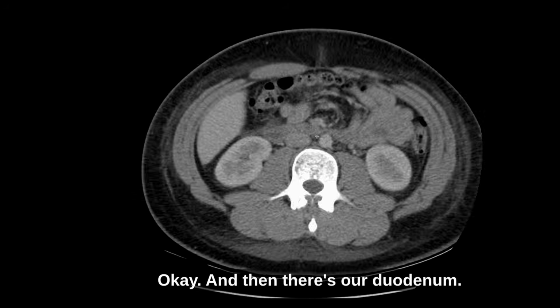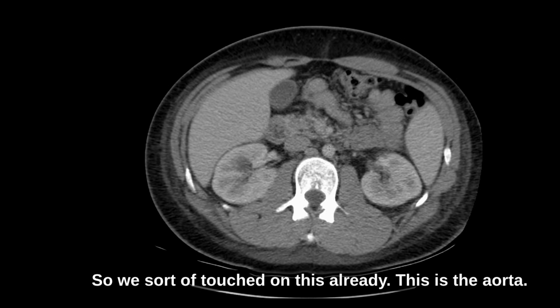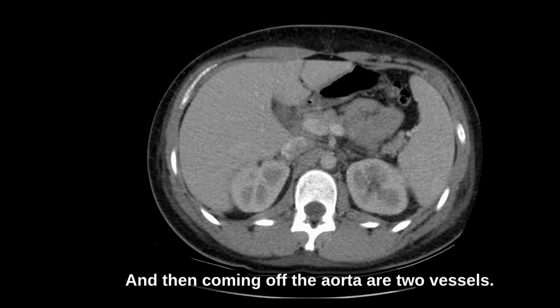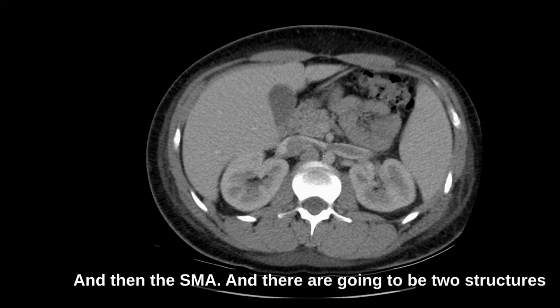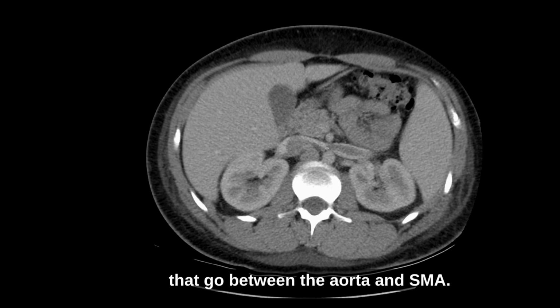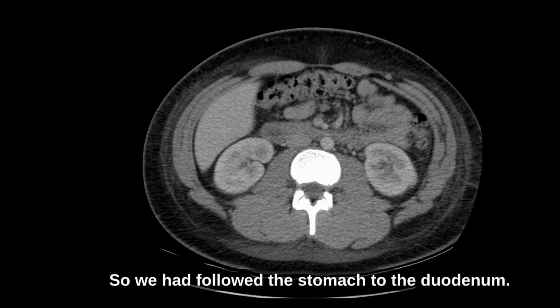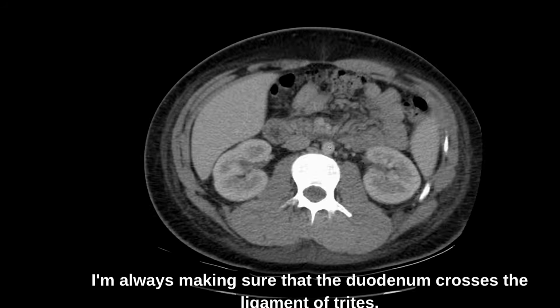And then there's our duodenum. And this is a very important landmark. So we sort of touched on this already. This is the aorta. And then coming off the aorta are two vessels. We'll have the celiac axis first, and then the SMA. And there are going to be two structures that go between the aorta and SMA. One is the left renal vein, and the other one was our duodenum. So we had followed the stomach to the duodenum. I'm always making sure that the duodenum crosses the ligament of Treitz.